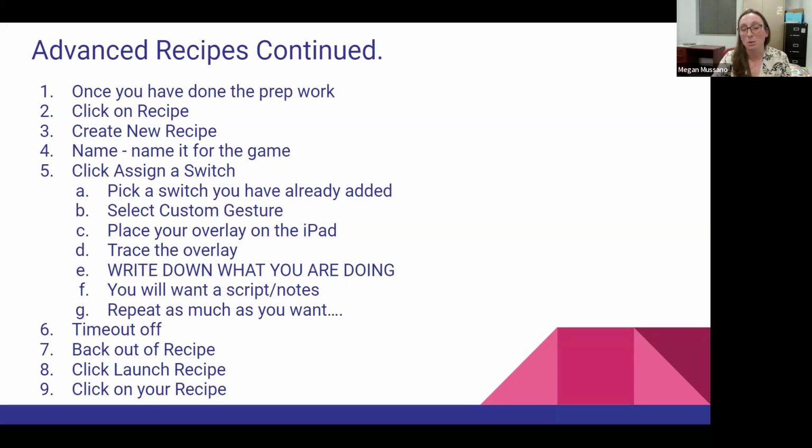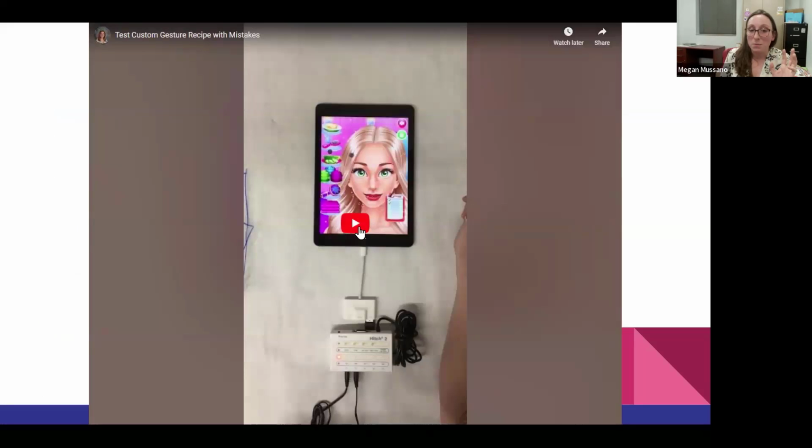Most of the activities or most of the programming we have on the student iPad is just those more functional tap middle of the screen and swipe left and right. So again, here's the directions for what I just showed you, and what it looks like in reality. I also put here, this is what it looks like once it's programmed. I actually left in some of the errors so that you could see some of the things I had to troubleshoot. I redid this video right away and I was like, no, actually I want to leave in the one that got messed up so that you can see some of the mistakes or the pitfalls. Just again, learn from my mistakes. That's what I'm here for.